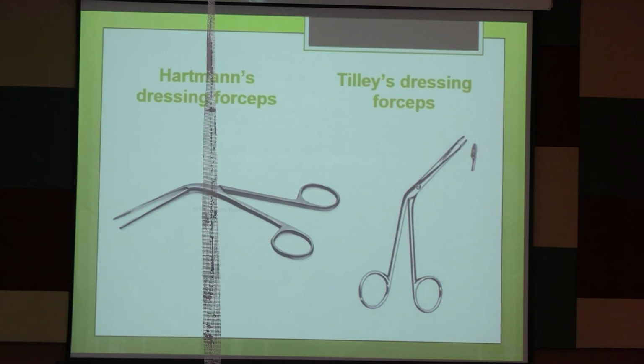It is a little bit swollen at the front, right? And these joints are a little bit different. Can you see? This one is a little bit longer. This is a little bit shorter. Joints are a little bit different and the ends are different. This one is Hartmann. This one is Tilly's. This is commonly mistaken.